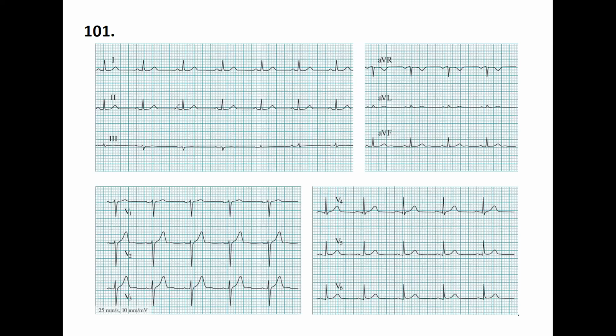So that's a sinus rhythm for sure, and there's a normal sinus rhythm. The next one, the electrical axis. Why do we need the electric axis? Because we want to use it to make a diagnosis.